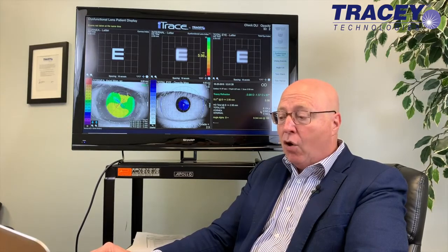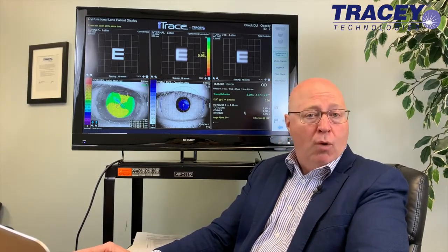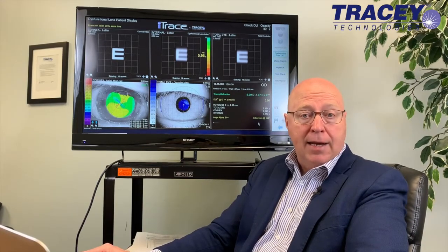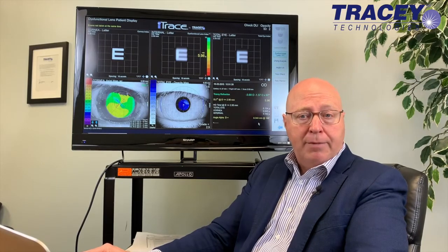You can look at it qualitatively, or down here under corneal high-order aberrations, you can look at it quantitatively. It's 0.05. If it's 0.15 or less, you're probably okay. If it's more than that, you're probably not okay for a multifocal. The second thing you look at is optical alignment. If this is over 0.5, it'll turn red, and it suggests a multifocal is not a good idea. It won't center on the visual axis, and you may have a risk of dysphotopsias.